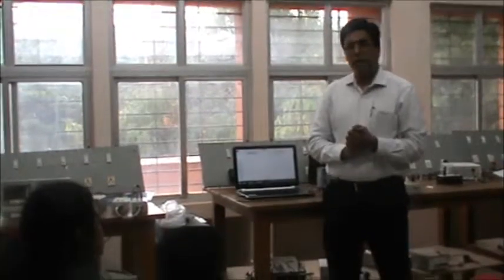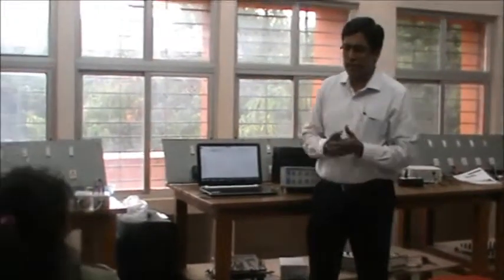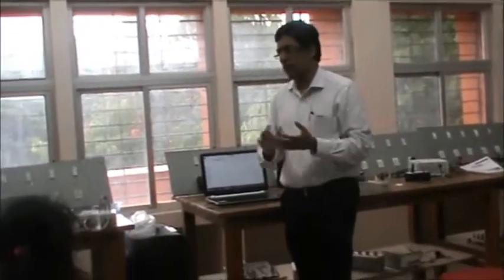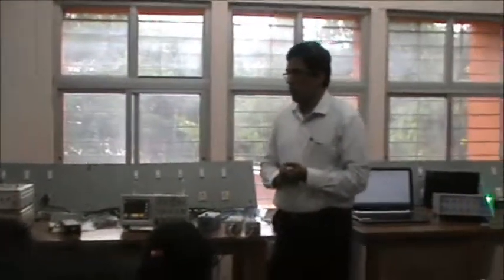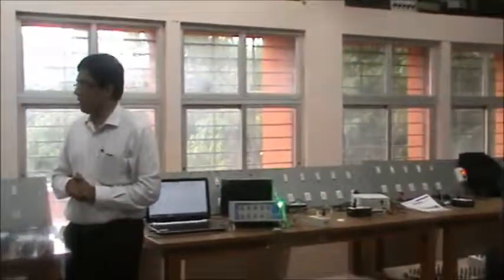Some modules like NI have a dedicated facility. This is not a dedicated facility. You can directly connect any physiological signals and you could do the analysis. Directly you can do it and then take it further. It's very, very simple. In 2 minutes you can record a data and import it.